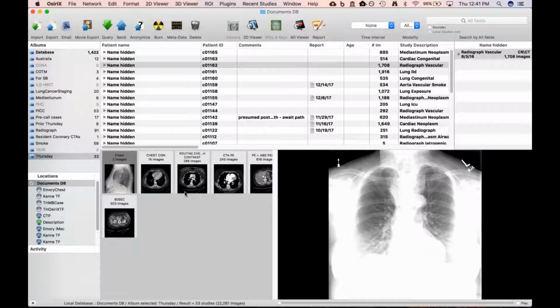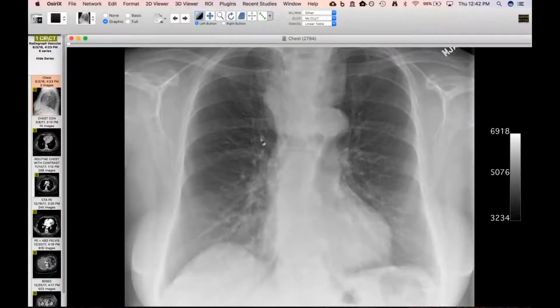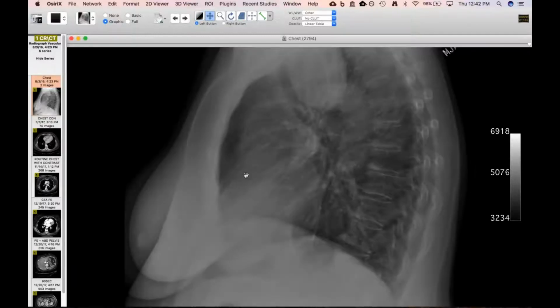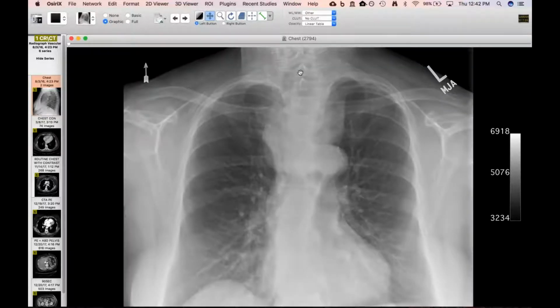Travis, I thought early on you made a good point, that as you said, they always teach thyroid in the anterior mediastinum, but I would argue almost all the time it's more retrotracheal. Yeah, no, that was taught to me early on in residency too. There's no thyroid in the anterior mediastinum really, when the thyroid is much more common to descend along the trachea like this. And this is always a big clue when you see that mass effect on the trachea when it extends out. And as Howard always likes to talk about, the cervicothoracic sign like this. Yeah.